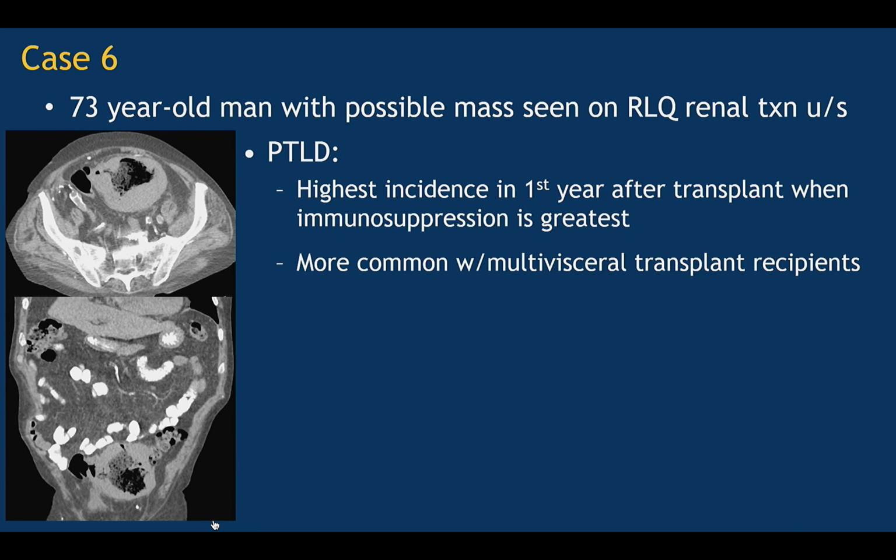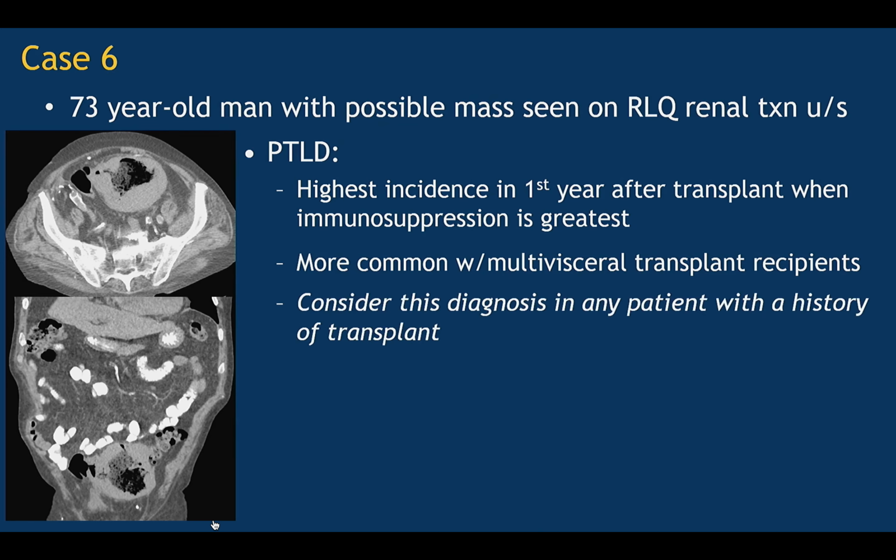PTLD has the highest incidence in the first year after transplant when immunosuppression is greatest. It's not surprising that it's more common with multivisceral transplant recipients when the degree of immunosuppression is greater. Remember this diagnosis when you see abnormalities in this specific subset of patients.